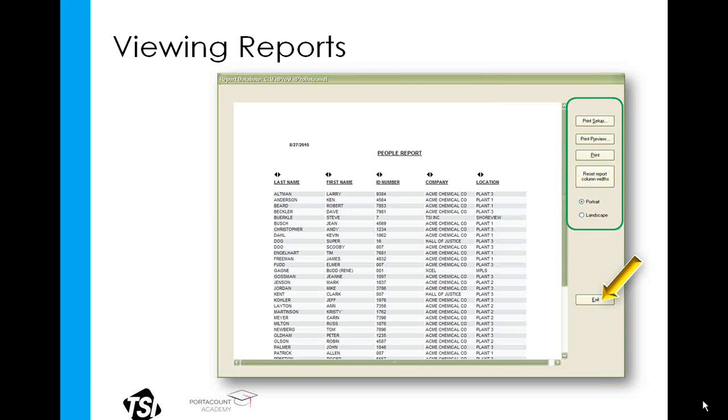I'm not going to go through each of these options, as the screens that appear are going to be dependent on your computer settings. And they should be similar to print functions you would find in any other program on your computer. Sort of an interesting fact to throw out there is that software packages such as FitPro or even Microsoft Word, etc., do not actually get to control any printing. Printing is always controlled by the Windows operating system. These programs just offer an access point, for lack of better words, to the Windows print options.